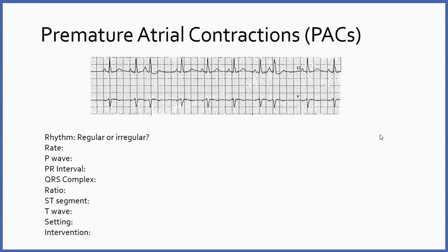All right, we're going to venture into something a little bit different. Premature atrial contractions, or PACs, are not a rhythm. PACs are what's called an ectopy, meaning that there's something happening on top of an underlying rhythm. Now, PACs are a real common ectopy. I would venture to say that all of you have had PACs at one time or another, and you may have been aware of it because it may have felt like you had a little bump in your beat. Most of the time you're not.